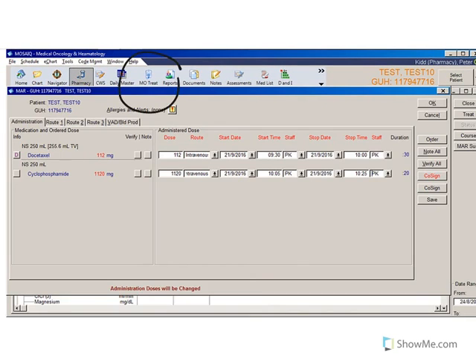And here, if the nurse were to tick MO treat, if it doesn't show up, you get it by customizing the top toolbar. The nurse can sign off, they can verify all simply by entering the time and their name here. If you don't want to verify all drugs, because usually it'll be one at a time, then you can simply press save and save an intermediate result before everything is entered.